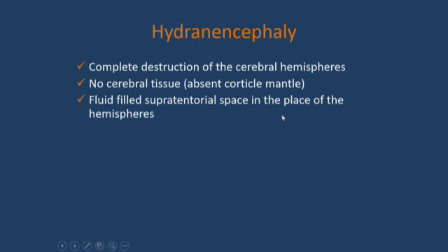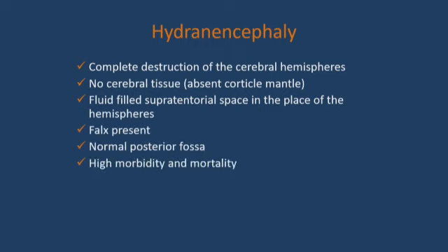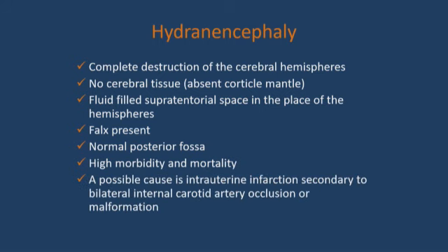They're going to take up whatever space is available. The falx is present. You have a normal posterior fossa. There's high morbidity, mortality. Possible cause for this is going to be some type of intrauterine infarction, secondary to internal carotid artery occlusion or malformation.